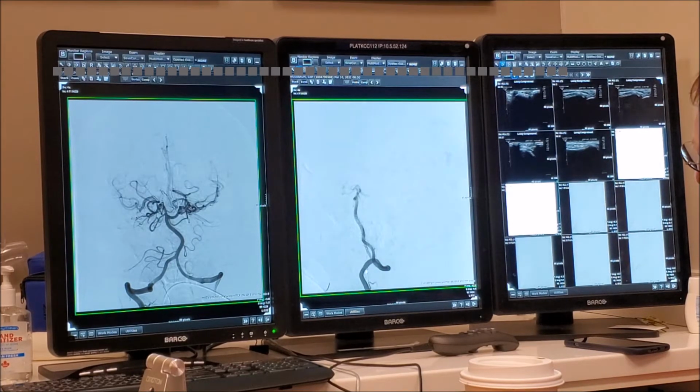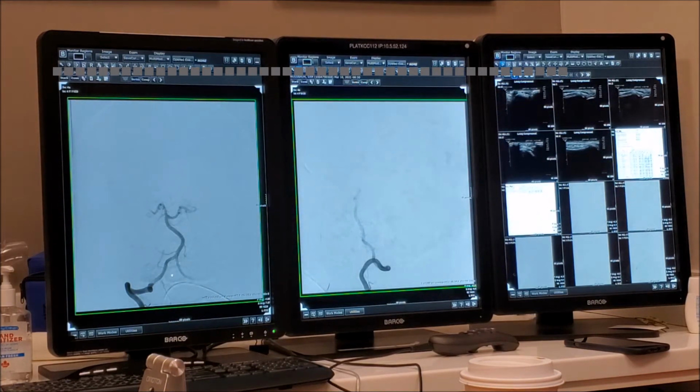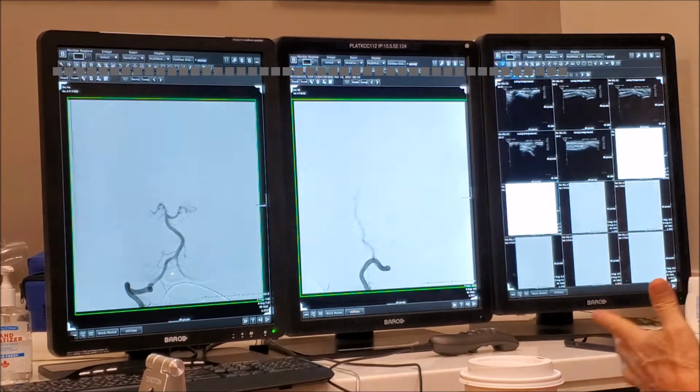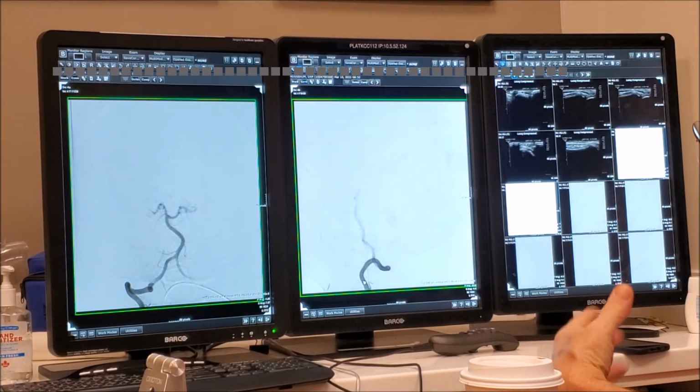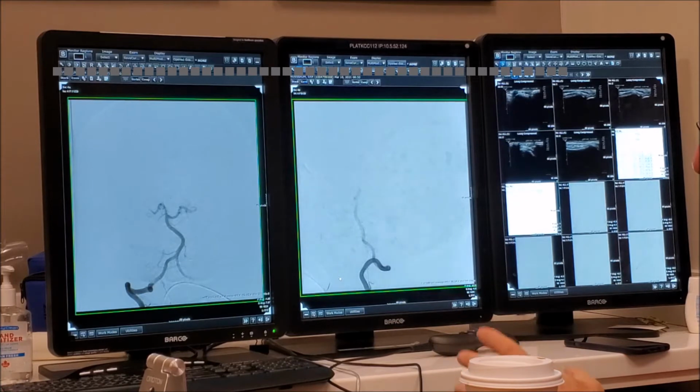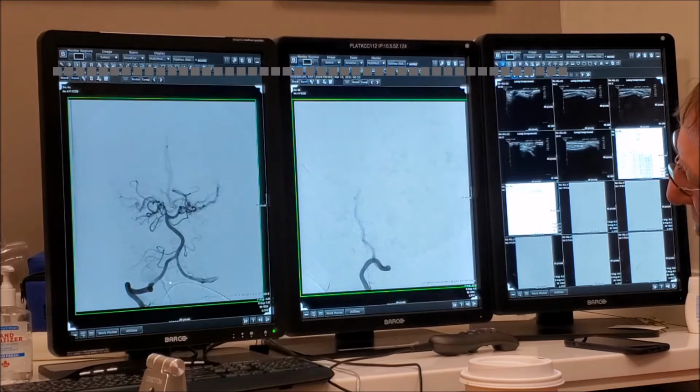Now, obviously this one is this one, right? Because I went back in the very early phase. So we're using the dynamic aspect of the angio, and we are quite sure that this one is this one. Agree? Yeah. And we know that this one is this one. Irrespective of the name, how do we work it out? Now the next step is to see if this one is crossing. Okay, no, it is originating from this vessel, which correlates with this.